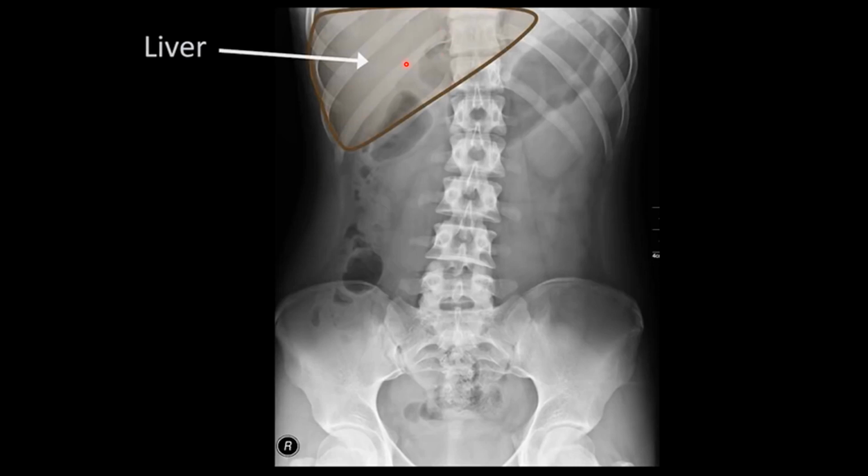So the liver casts a shadow which merges with the right dome of the diaphragm above, and sometimes it presents a well-defined lower border close to the right costal margin. That is very difficult to identify. If you look carefully and the exposure is good, we may be able to see that. Towards the midline, the shadow merges with that of the heart and vertebrae, and the left extremity of the shadow will be superimposed on the transparent gas bubble of the stomach, and usually that is not recognizable.